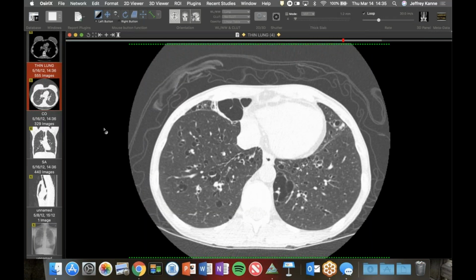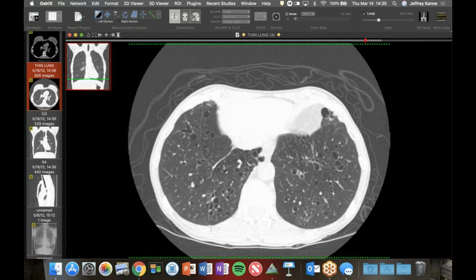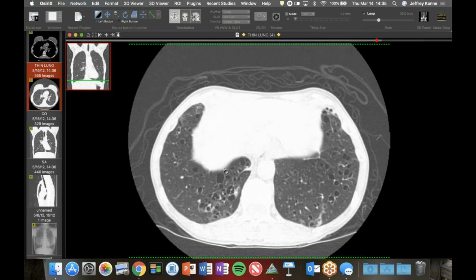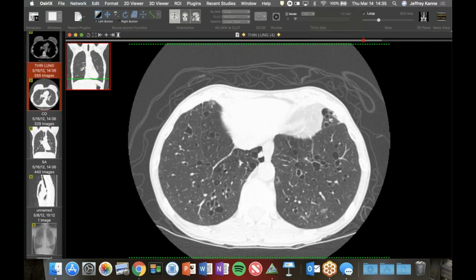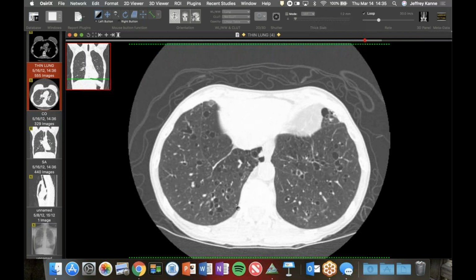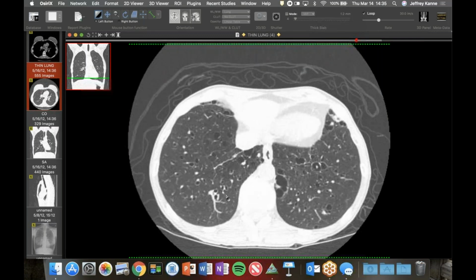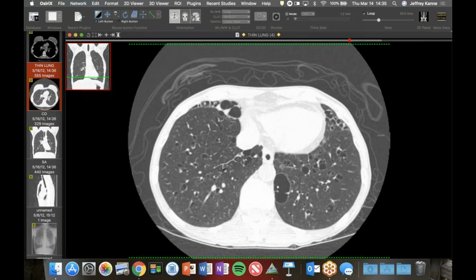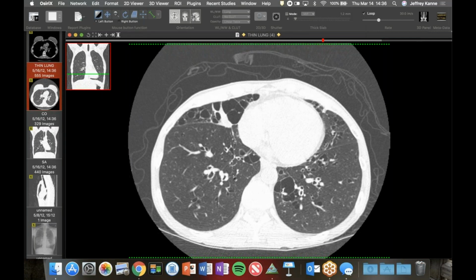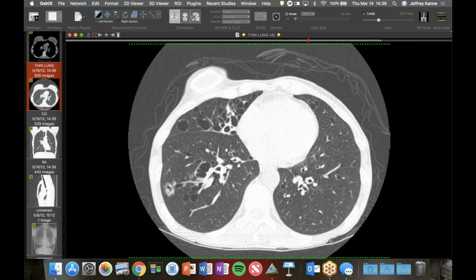Other thing, Jeff, if you scroll through the lower lung zones, for example, obviously we see big round cystic spaces, but look at the bronchi, and in some locations I think I can see that there is bronchial dilatation. Absolutely, right here, for example, you can see there's an artery. Yeah, anterior, right there, you'll see that there's bronchial dilatation. Yeah, in quite a few places. And I think that may be the post-obstructive phenomenon related to the more central disease.